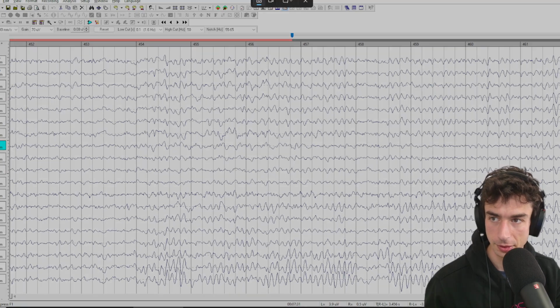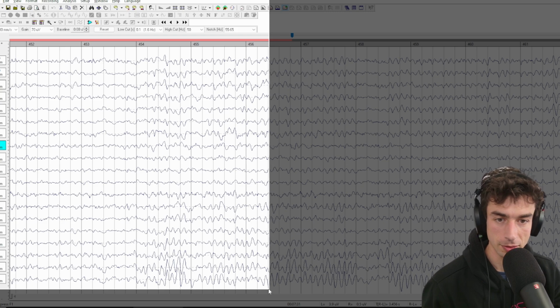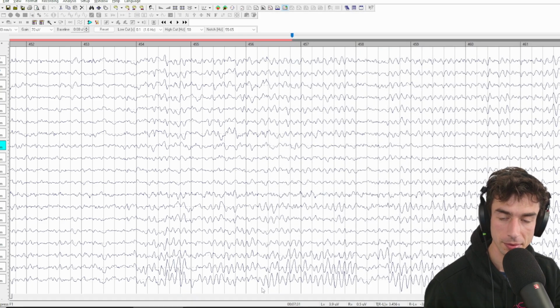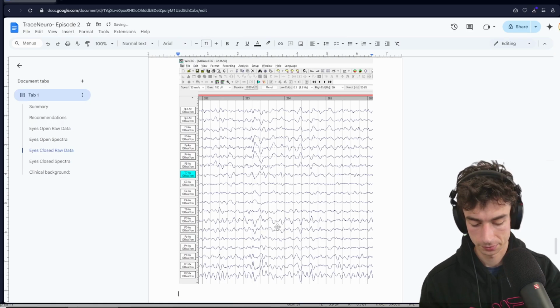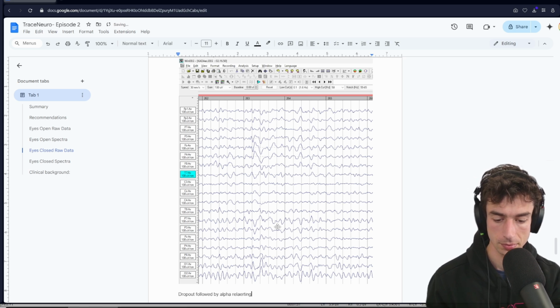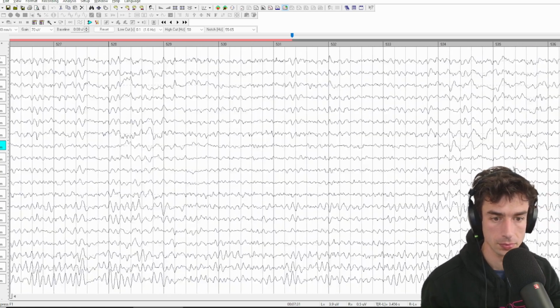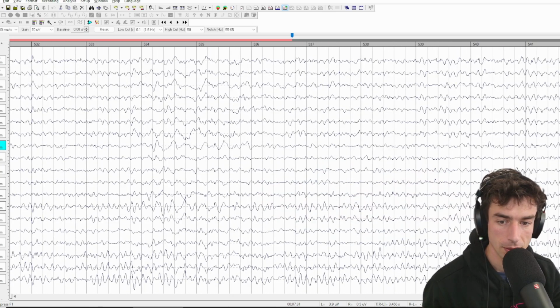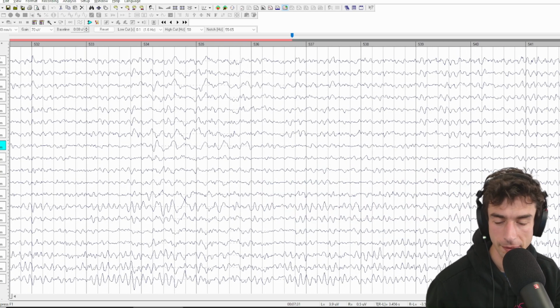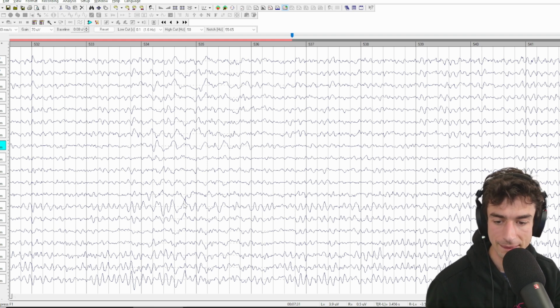And we can grab this and call this dropout followed by alpha realerting. Here's another instance of that sort of frontotemporal slowing.